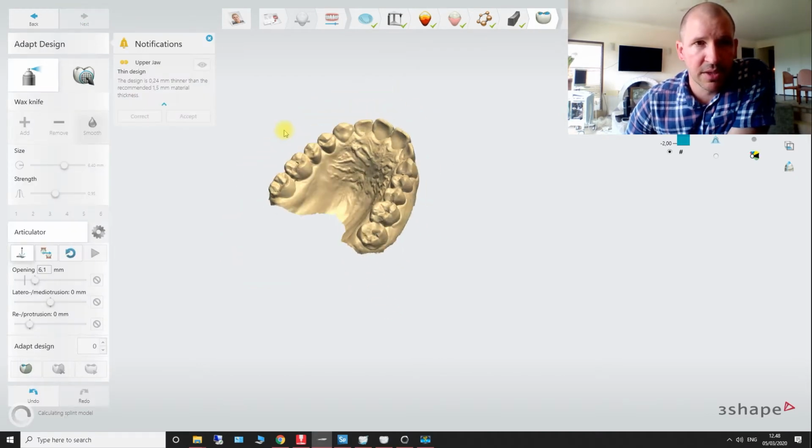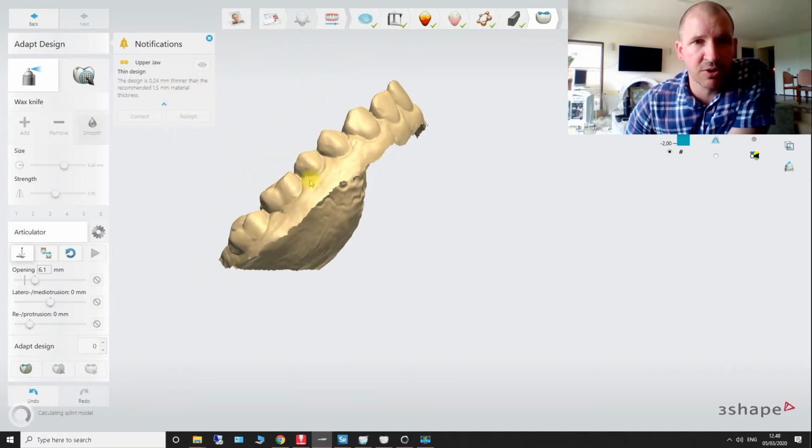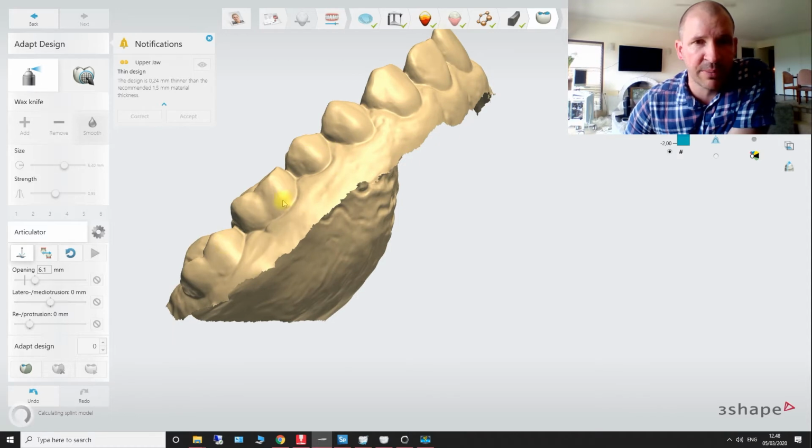Next. Once it generates our splint, I'll show you what I mean by choosing 1.5 mil.